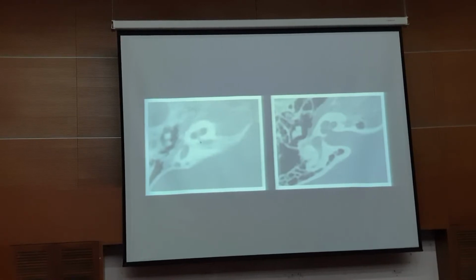aplasia. But if I do see a nerve coming off the pons, but just not the cochlear nerve itself, then I'll probably favor saying that there's severe hypoplasia or hypoplasia of the cochlear nerve itself. So that's what I tend to do. Because a lot of times, when structures are so small, they are known to be below the resolution. So in other words, current technology cannot resolve the structures because they are just so small. But we rely on seeing the bony structures and try and give a best guess, as it were.